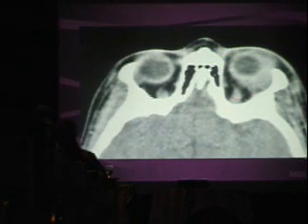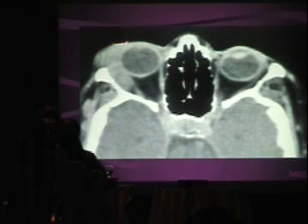If you have any other irregular muscle involvement, always think pseudotumor, which is what this is, but this could easily be a lacrimal mass as well. If you see a mass that is going through different spaces, we talked about preseptal versus postseptal, bridging those spaces.